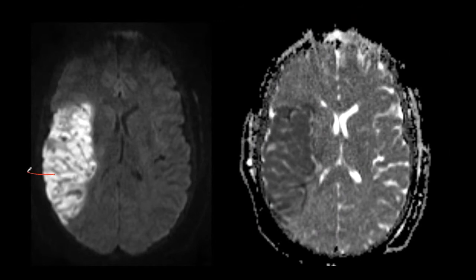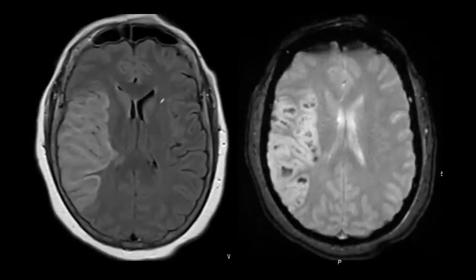So you get the MR, and what he said is what we see here. So it's hyperintense DWI signal in the right MCA distribution with hypointense ADC. So that's restricted diffusion. And this time, we definitely do see changes in the FLAIR signal, that is hyperintense signal. So it's not hyperacute. It's already beginning to get to the acute stage. And in the gradient sequence, you can see hypointense signal areas, which means there's hemorrhage in that region.